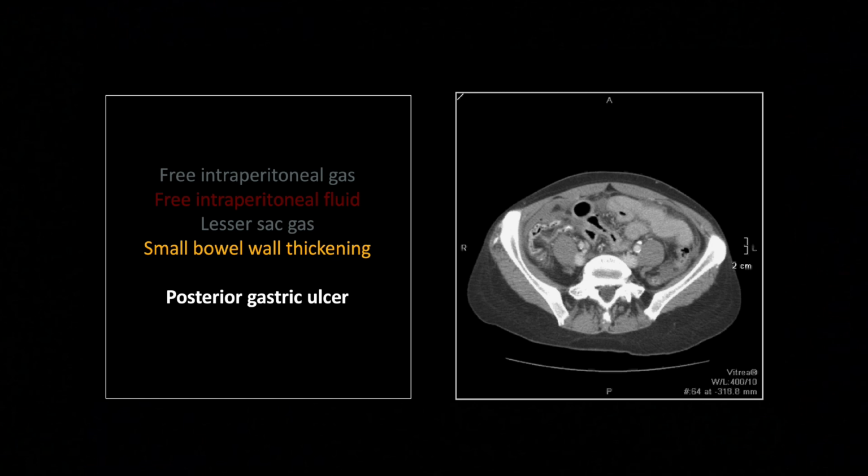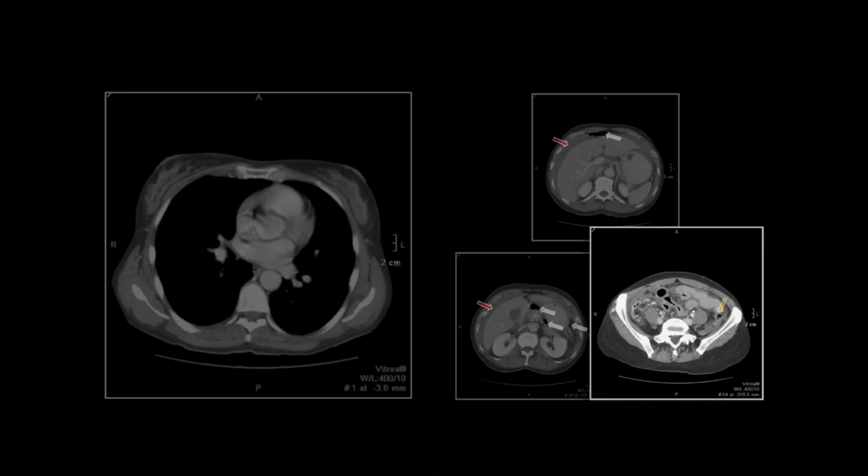I've always noted that in the rest of the abdomen, when you have a gastric rupture or perforation, it tends to bathe all the bowel loops in gastric acid, and they will get thick-walled, just like this. So the inflammation will be apparent elsewhere throughout the peritoneum, especially in gastric ruptures. Obviously, that gastric acid is so caustic.